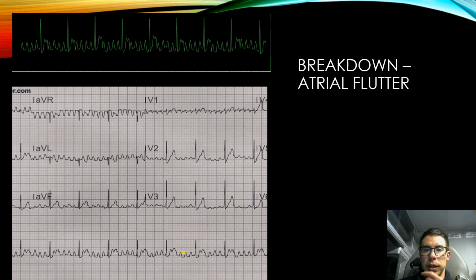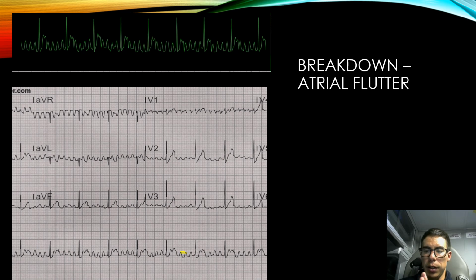So look at those T waves, just so you can really see what I'm talking about with there being a P wave within there. Those tips look exactly like the P waves, so that's why I say 4-to-1.